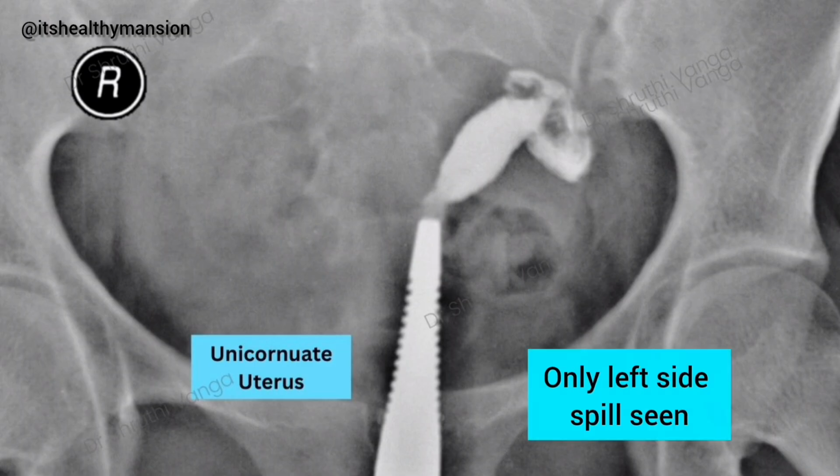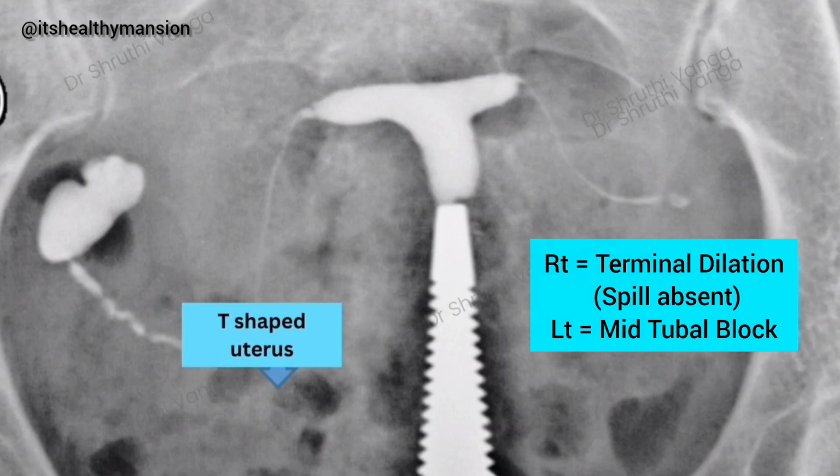Now here we may see there is only one cornua in the left side. So this presents a unicornuate uterus, where the cornua is present in the left side and absent in the right side. So there is spill seen only in the left side. Now this is a film where we see the uterus is T-shaped. So it is a T-shaped uterus. There are some fallopian tube abnormalities in this HSG film, which we are going to discuss in part 2 of the HSG film video.